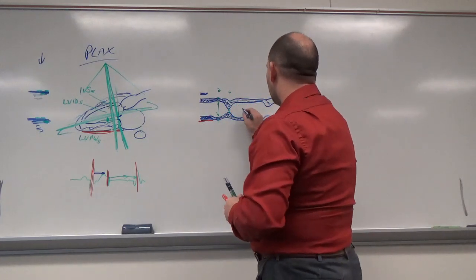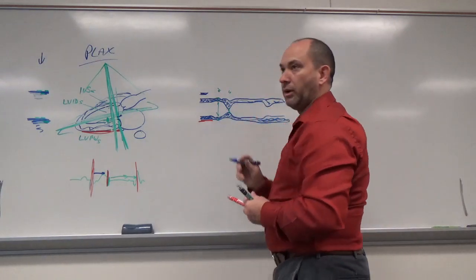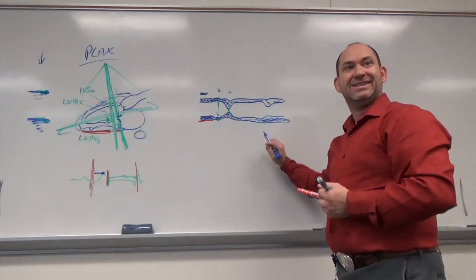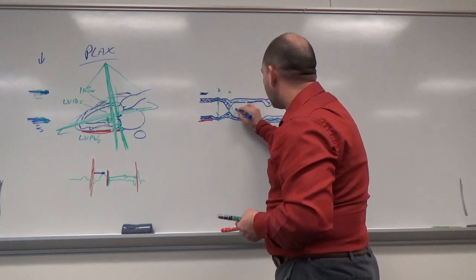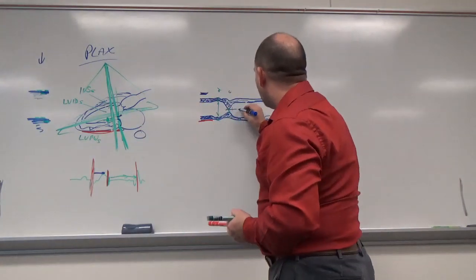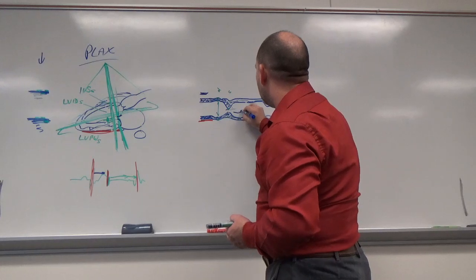But now inside here, this is systole, and diastole is the big section in here. When does the mitral valve open? Not during systole. It's diastole, right? So early on it opens. After this finishes contracting, you'll get a closure line of the mitral valve tips closed together through this area. That'll actually be kind of further back, more like back here. And then you're going to see the E wave.